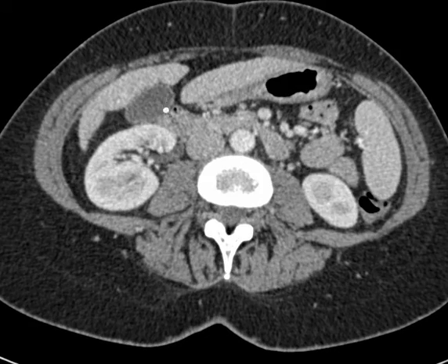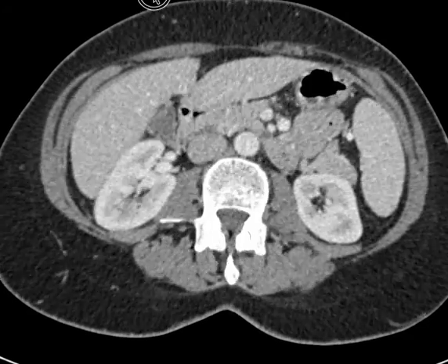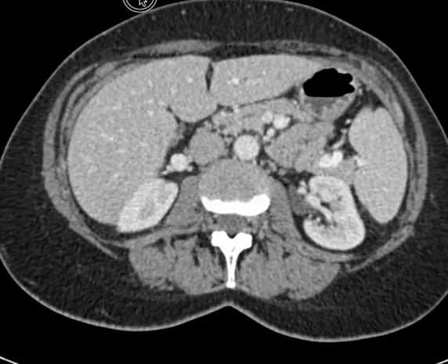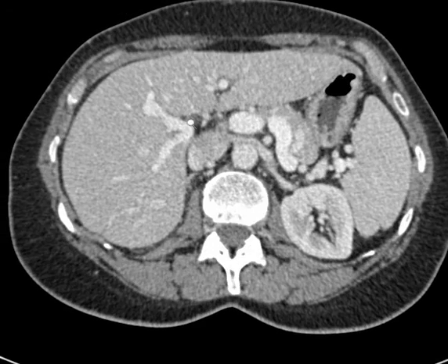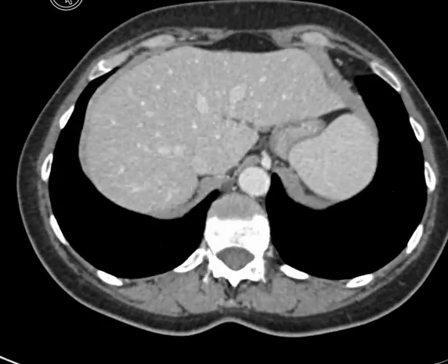This is the gallbladder right here. It's low density because it's just fluid filled, and that fluid doesn't really enhance with the intravenous contrast. Again, here's the gallbladder. Now this is a CT scan, and so seeing the bile ducts, which are part of the liver, is much harder on this, but you can see a little bile duct right here. So this is a bile duct, but if you really want to see them, there are other modalities that we use.